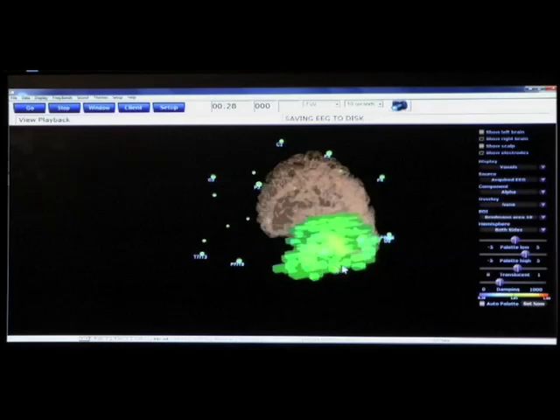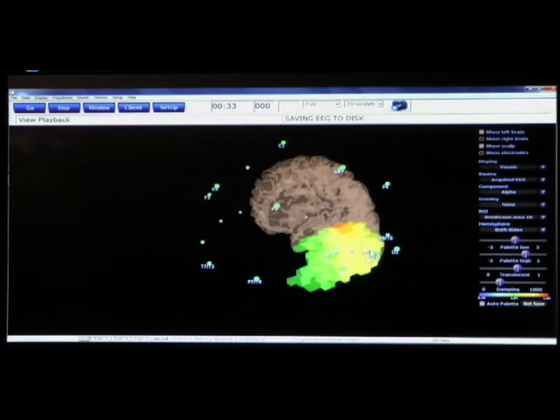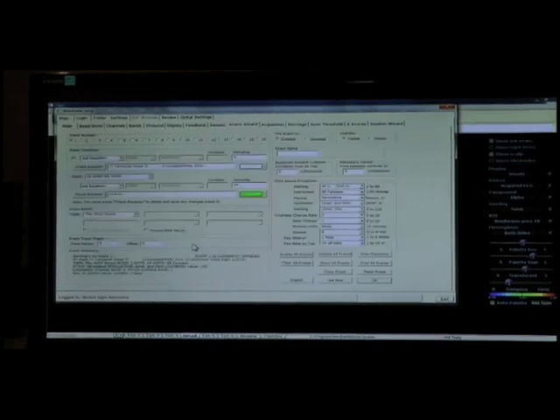What I want to talk about in this section is how to use the event wizard to get the data about this brain region and use it for training. So what we'll do is I'll demonstrate. We go into the settings, BrainMaster setup, we go to viewer change settings, and the thing we want to look at is the event wizard.